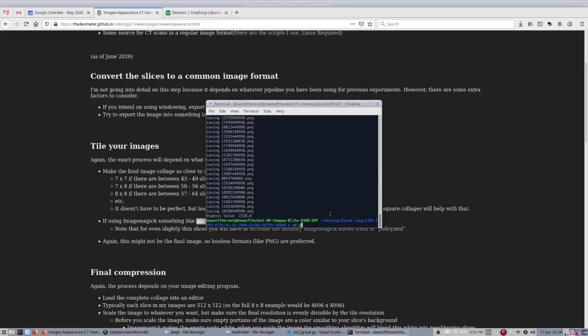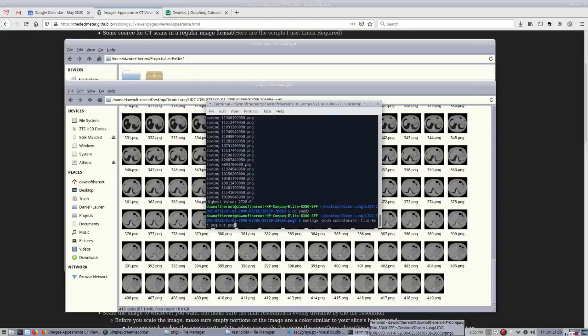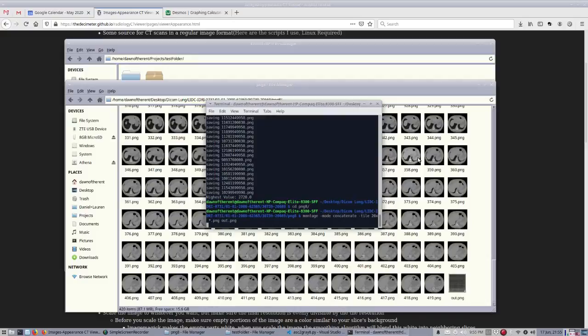Let me go to my PNG directory. I'm going to delete one of the images because 20 times 21 is exactly 420, and every image set I've demoed has made perfect use of the image dimensions given to it. So I want to show that it doesn't need to be the perfect amount. So I'm going to tell ImageMagick's montage function to make a grid that's 20 by something. It can choose what that something is. It's going to be 21, but all right, and it's done.